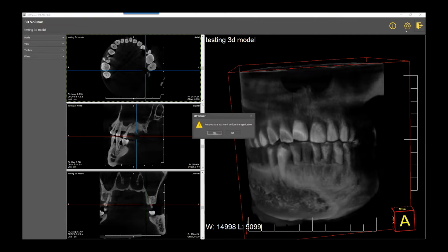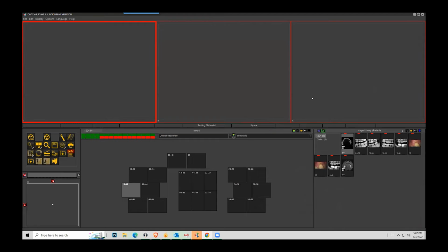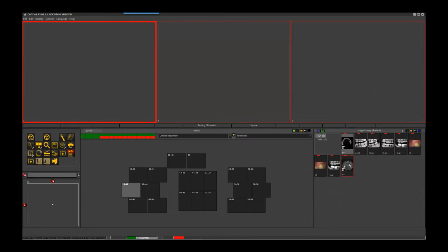Okay. So you saw how he was able to slide through, so you can see the different layers, right? Yes. And so, if I'm understanding correctly, this is able to be on the TV monitor that is at the 6 o'clock in the room, in line with the patient chair, for them to be able to look at.